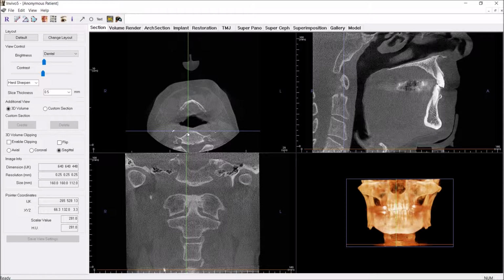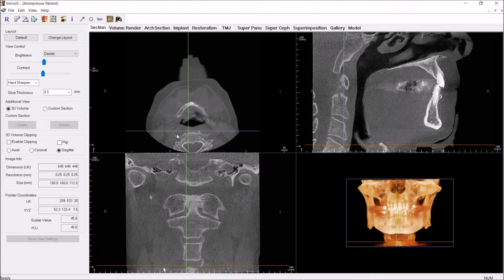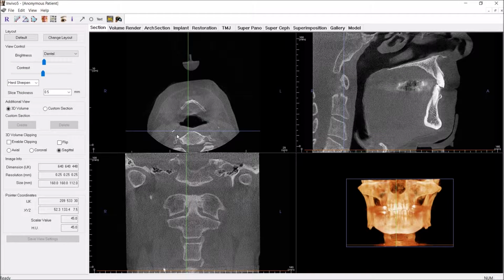There's different opinions on whether they should be referred. There's a lot of other significant factors. This is pretty slight calcification. I'm not worried of stenosis or blocking of the artery, but some studies do say that any amount of calcification increases the likelihood of an ischemic event, a stroke. So the patient, I think, should be made aware if they have other risk factors like high blood pressure. Maybe you do want to refer them to their doctor, at least a written referral. And if you see a lot more severe, where it does look like there's stenosis, or where it actually looks like it's blocking the lumen of the artery, that's obviously a more significant case.